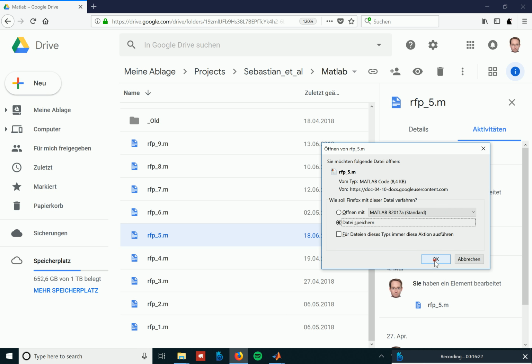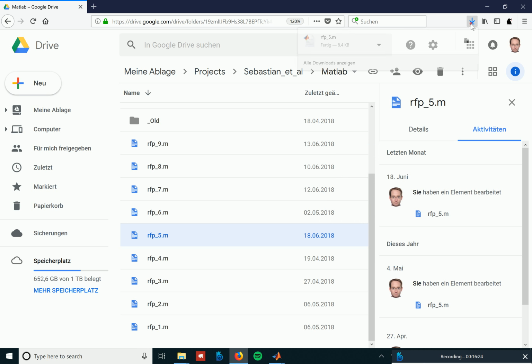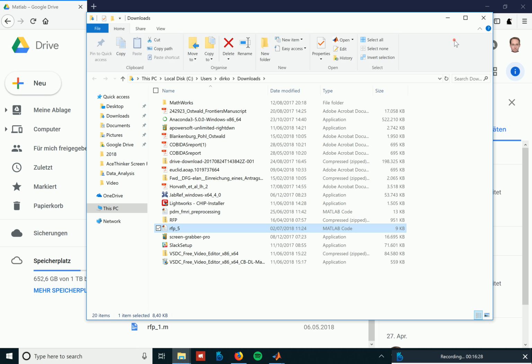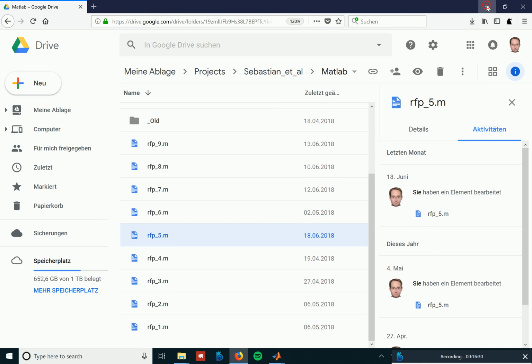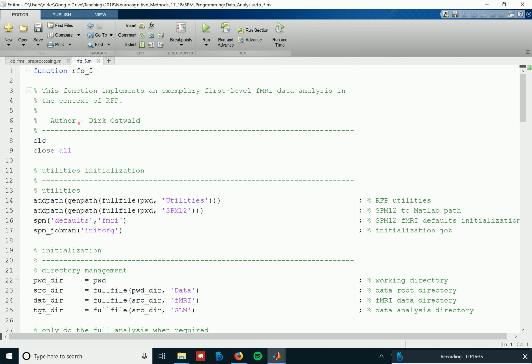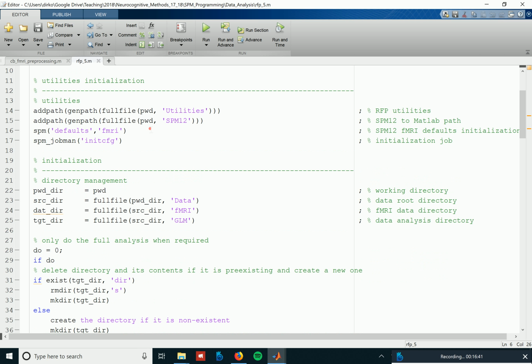So again, we have some script that somebody else wrote for us, which we can build upon. And let's do that. So, oh, it's not somebody who wrote it.